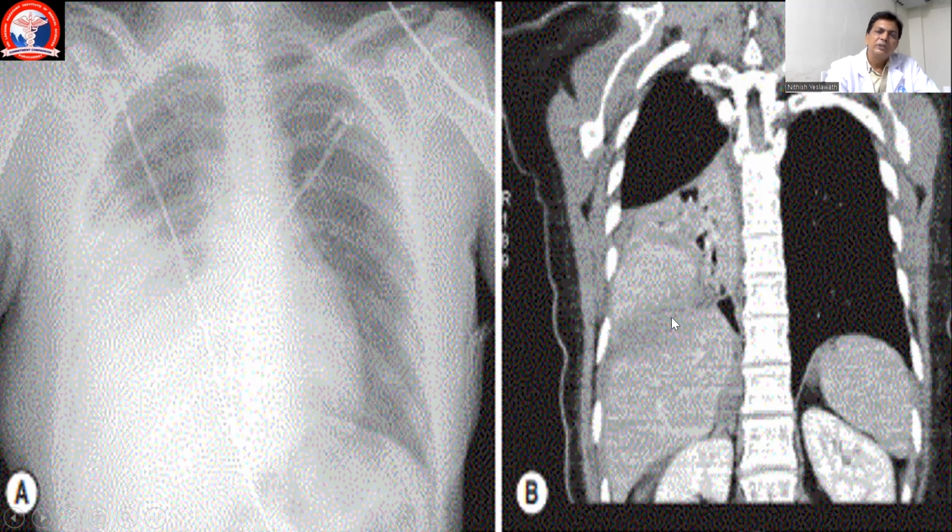And what we are seeing is herniation of the liver. Another finding here is some lucency or indentation on this side. These were the edges of the torn diaphragm, which are still restricting the liver from going up. Because of that, this notch has come on the liver in this region. So this is again a ruptured right dome of the diaphragm with intrathoracic liver herniation.